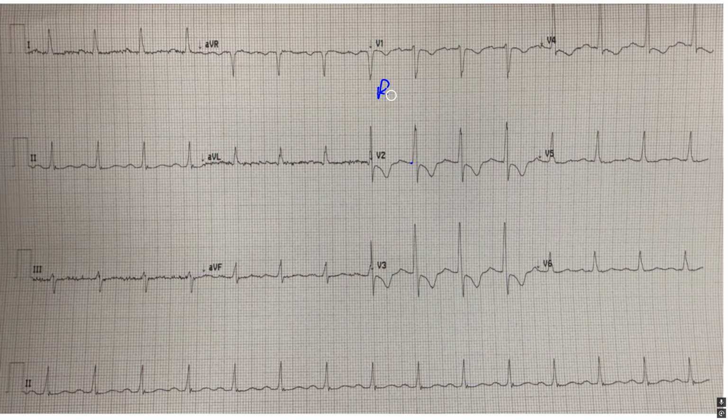Looks to me like a right bundle branch block, okay, because it's greater than 3 boxes. For the QTc, does not look prolonged to me, so intervals look okay. Now let's look at our ST waves. I always start in AVL. Number one, I'm always looking for inversion of the T wave. This is flat, which is non-specific. I'm not seeing significant J-point deviation. I do appreciate a fractionated QRS here, which I can also see here and in here as well, which is indicative of probably some type of structural heart disease. You can see it there as well.